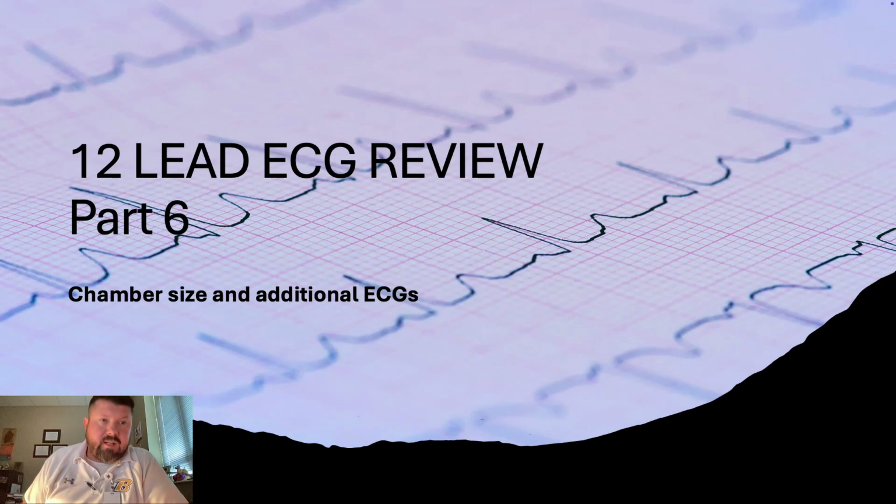Part 6 of the 12-lead ECG review. We're going to talk about ECG changes related to chamber size, atrial and ventricular chambers, and some additional ECGs that are not necessarily cardiac in nature, but are other systemic issues that could cause ECG changes.